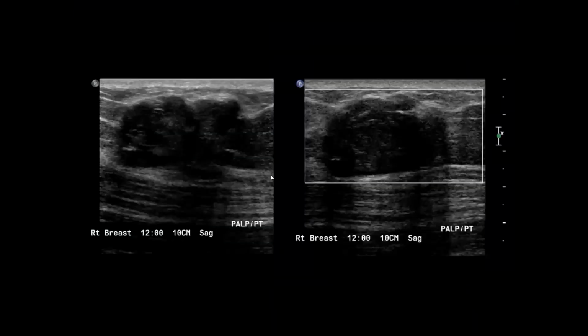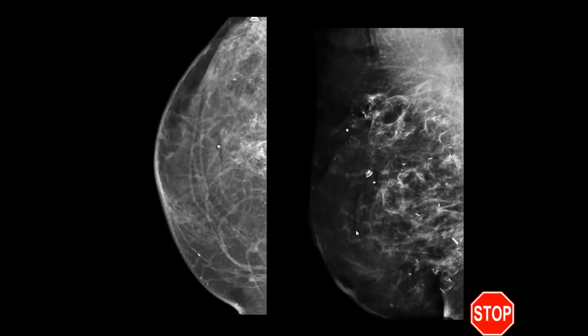So what we saw here is we saw this kind of macrolobulated hypoechoic mass with some echogenicity in it as well. There is some shadowing. And so with the mixed echogenicity, some hypoechoic, hyperechoic shadowing, I was wondering, you know, it suggested maybe this is fat necrosis. So we did a mammogram of the area to confirm that we have this, what we're starting to see, eggshell calcifications forming around fat lobules, which is pathognomonic for fat necrosis.